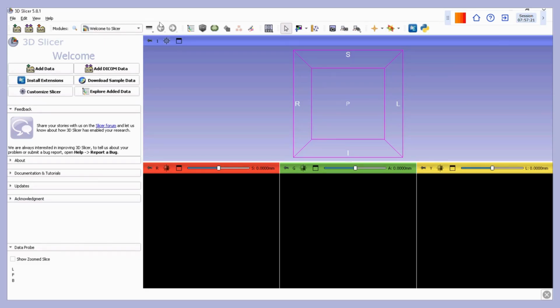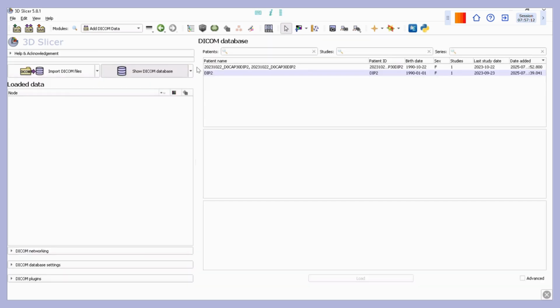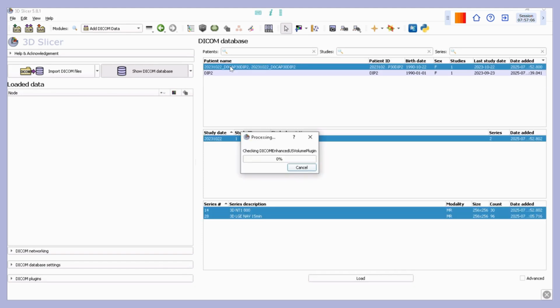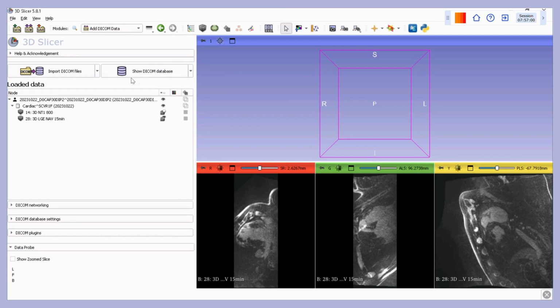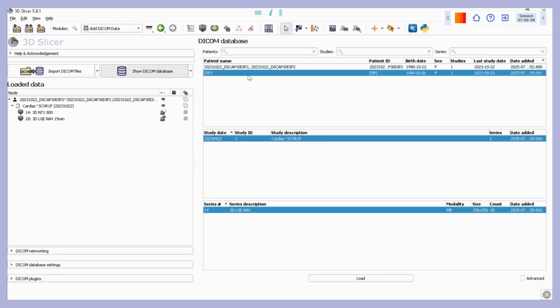First, we've saved all the DICOM files for the pre-ablation LGE, post-ablation native T1, and post-ablation LGE in 3 separate folders. Then we go to our DICOM data and load it. Since I've had it loaded already, I can access it here in the DICOM database, as you can see. And loading each one takes some time, but once you've made the upload, it'll be stored in your database where you can access it whenever you want and as you need for the project you are working with.